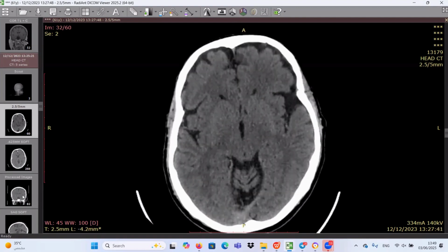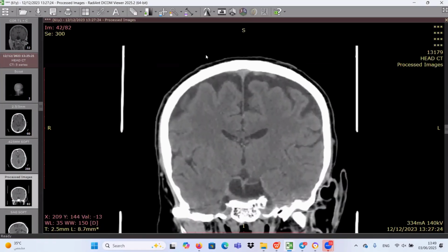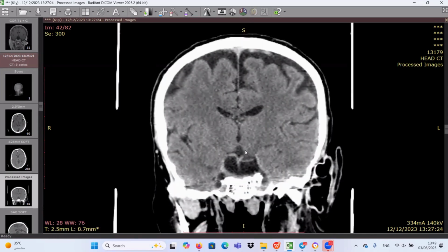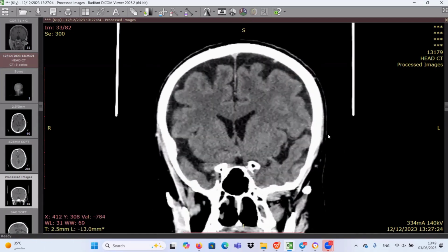I'm sorry. Can you go to the coronal plane? Maybe helpful for you to pick up any abnormality, because it's a little bit difficult and needs more time. But okay, go on. Okay. You can scroll now. Yeah, I can scroll.